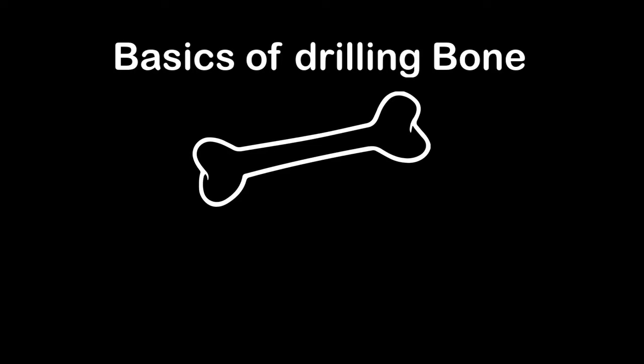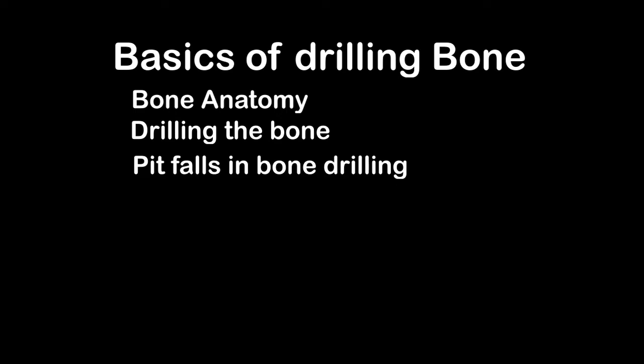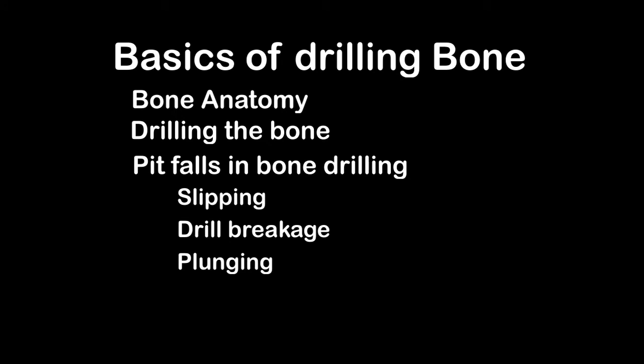Welcome to the Etalo video on the basics of drilling bone. In this video, we will learn about bony anatomy, how to drill bone, and some of the pitfalls we find when you drill bone. For example, slipping, drill breakage, and plunging.